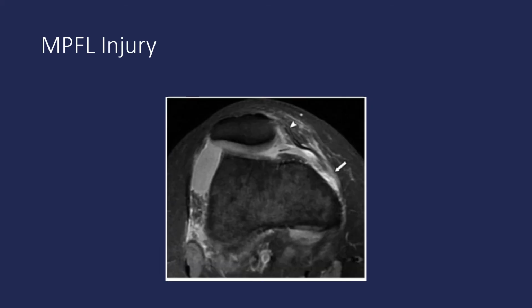In this image of a 39-year-old female, we can see a detachment of the femoral MPFL origin, indicated by the white arrow. We can also see a partial tear of the patellar insertion, indicated by the white arrowhead.